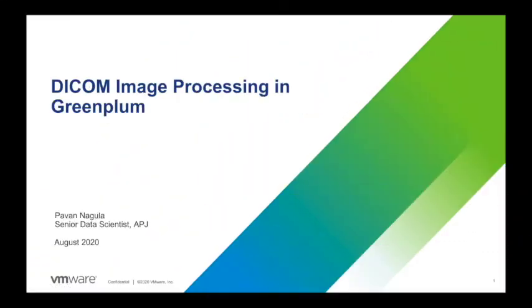Today I'm going to demo DICOM image processing in Greenplum. DICOM images are medical X-ray images, mostly in grayscale format.